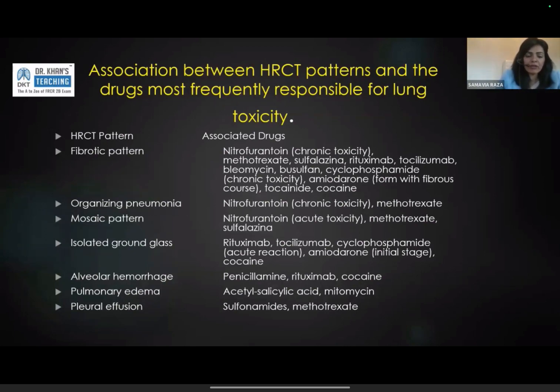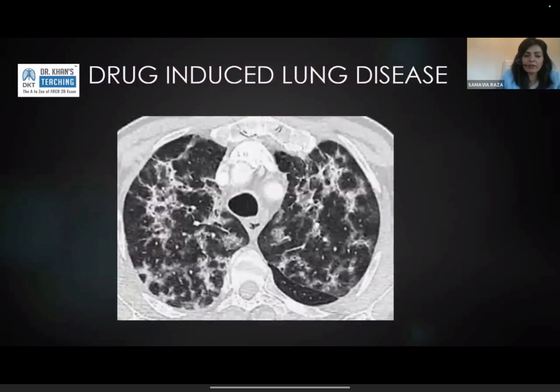In terms of the pattern itself, unknown drug, that's your presentation. That's bilateral architectural distortion, ground glass tending towards consolidation. Can you think of any infection that would look like that? Can you think of ARDS that would look like that? Would pulmonary edema look like that? You can't really fit into anything else.